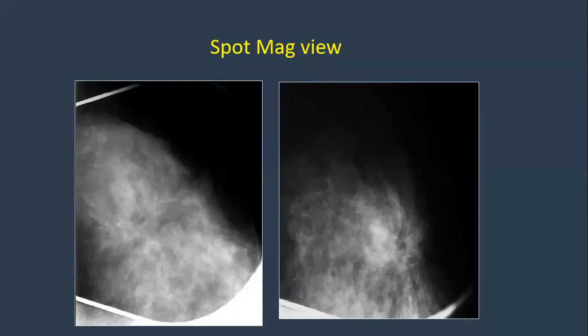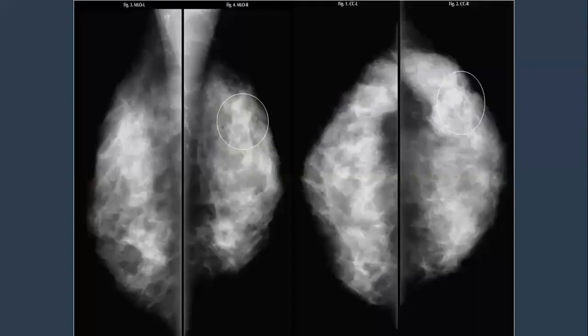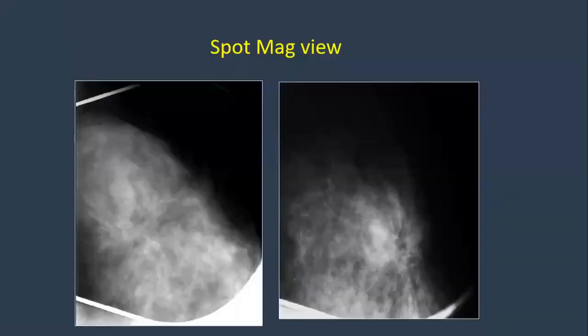I did not see radio-opaque clips to make sure this is a site of biopsy. But there is a skin change, if you look here. I have to ask exactly where the site of previous biopsy was. That was the site of previous biopsy.